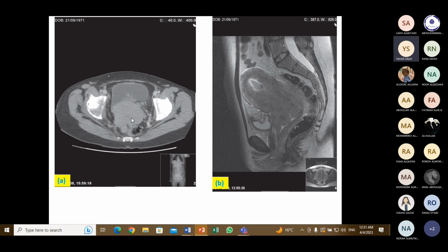Of course for the diagnosis, now we brought only one section, but as I told you several times, you can follow this and see all the sections above and below this level, so it becomes easier. From one image there is usually a difficulty, but if you look at all the scan slices from down to up you can easily detect the abnormality. This is the lesion or mass at the cervix, and this is a uterine carcinoma.